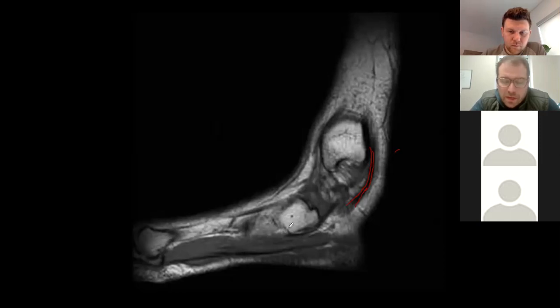So you have your posterior tibial tendon running along and then attaching down distally to the navicular, and then its other branches too. So if you follow that down, what I think Dr. Rosante was drawing there, what bone is that identified as attaching to? Good, right?